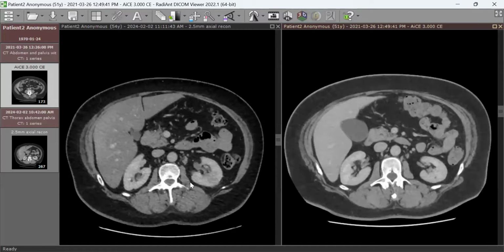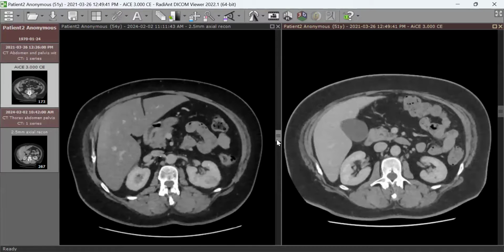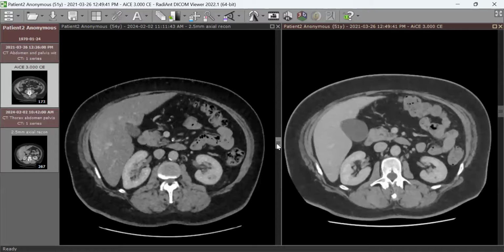So for this lesion, it is T1a and N0/1 because we are not sure of this one, but definitely it is suspicious, and there is no metastasis. That's M0. So you write this in the report, you mention all the findings, and what do you mention in your recommendation?